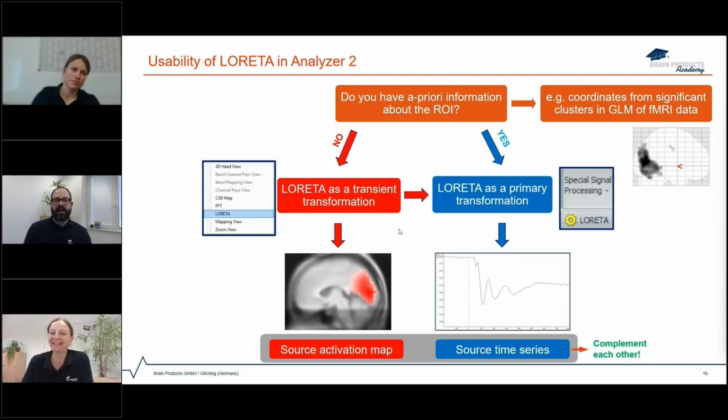No, not really. I mean, the edit markers transformation is the go-to if you know where to put the markers. If you want to detect somehow where to put the markers, then of course what we just used might be an option. And there are also other tools in Analyzer, like the level trigger, for instance, that also allows you to put markers based on a threshold that is surpassed. And other tools even that allow you to put markers based on reference markers. So let's say you have a marker in your data and want to add another marker always at a distance of 1 second. That's also possible. So plenty of options.